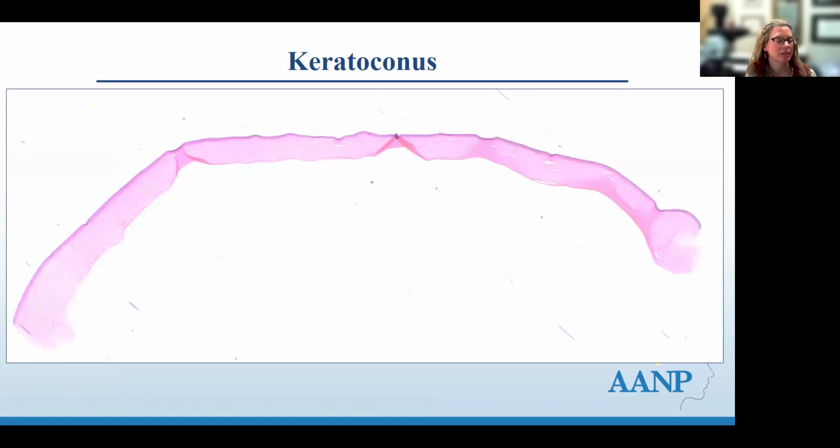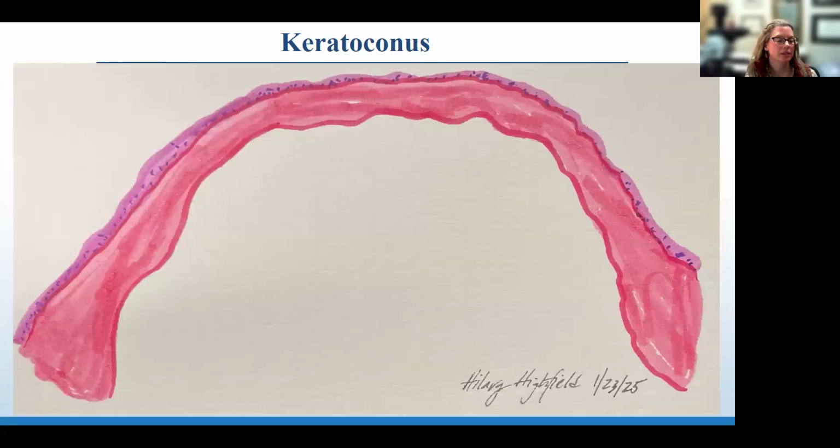So let's look a little bit closer. Here's the overarching view where you see the edges have the full stromal thickness that's normal. The stroma in the middle is very thin, and again, there's the other thick edge on the other side. Then here's another artwork of mine, the overreaching view of what you see: thick at the edge, thin and folded in the middle, and stromal thinning.